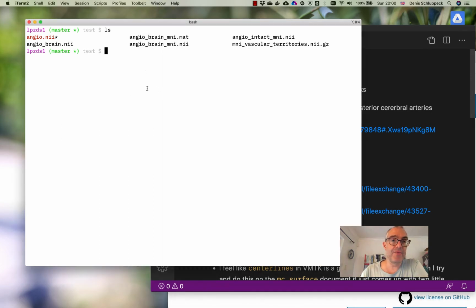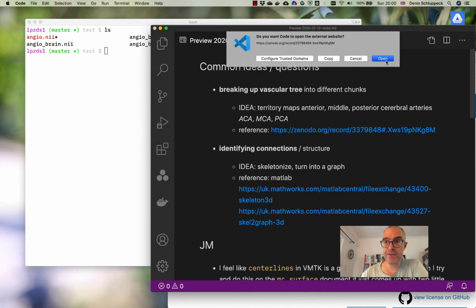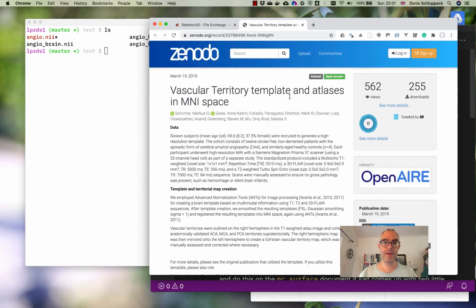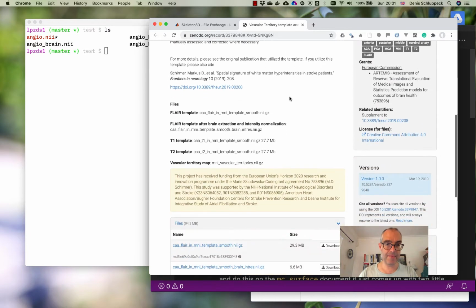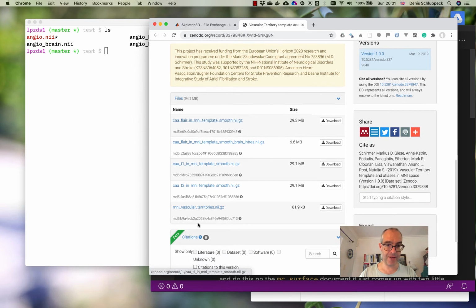These are the files that you already should have from the previous video. The only other thing that's new here is this MNI vascular territories file, which I downloaded from this particular link here. So let me just try and open that so you can see where that is. And you can see here, there's a whole bunch of files available. The one I downloaded and provided in our shared folder is this vascular territory map, which you can look at in a second. Okay, that's this file. It's a small file.